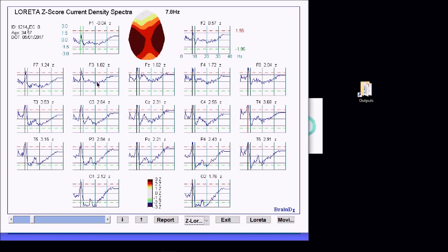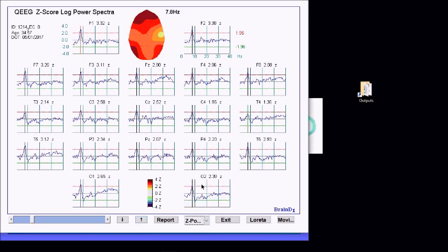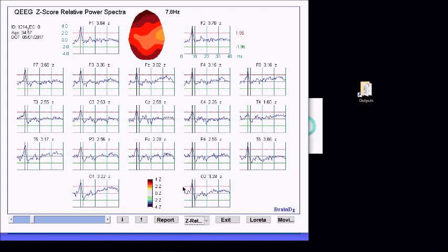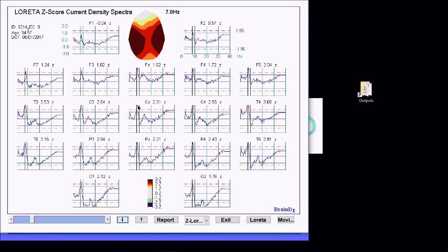You see a different location for this phenomenon. You can zoom out. You can use this arrow to check that out. I just did with the up arrow. I moved my scale from 0 to 3 to 0 to 4 now. And let me go back up to Z power and see that the location is a little different. We learn a lot by having different perspectives. These three calculations are very much in that sense of perspective. I'm going to go back to 3Z.